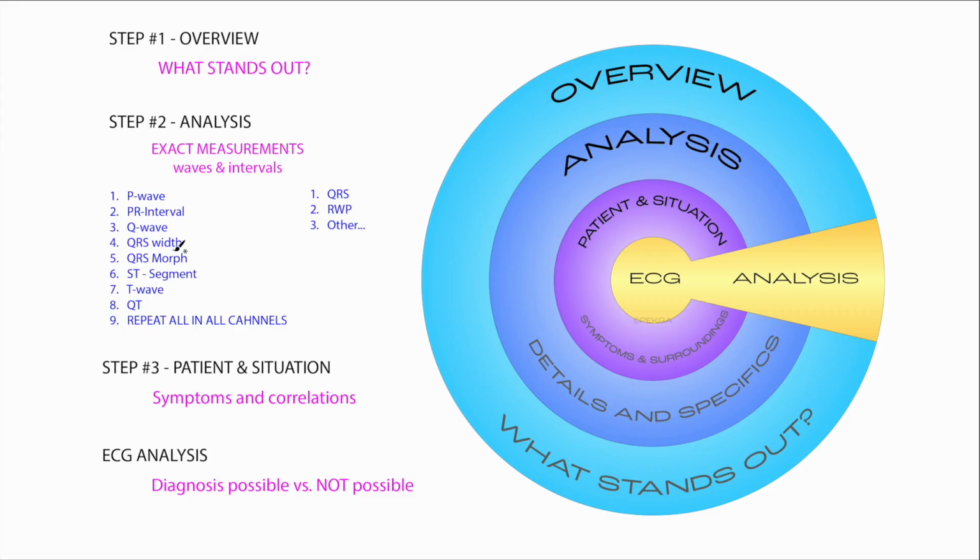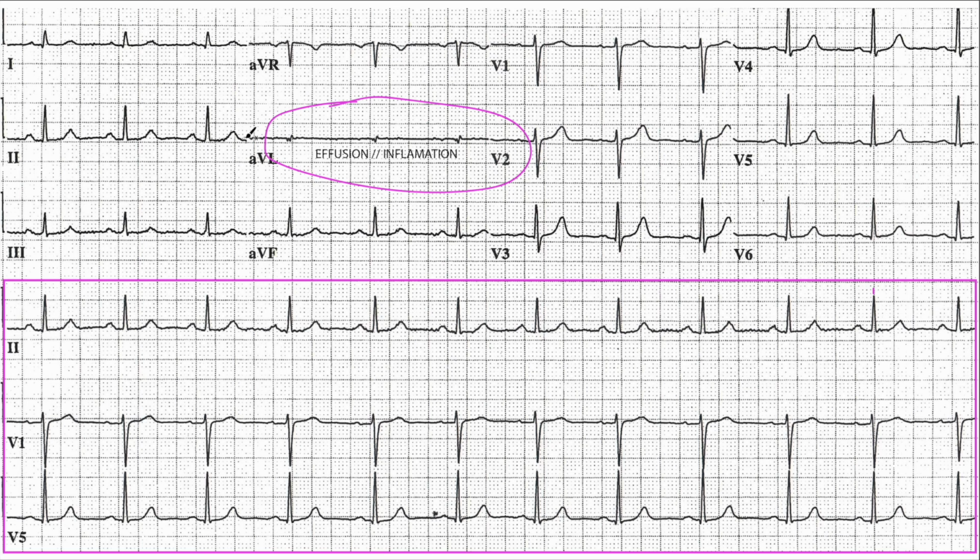However, when you're dealing with 12 leads, you can do this 12 different times if you really want to be thorough, right? I'm going to start on this side over here, and I'm just going to grab this QRS real quick. I like to do that. We use axis of deviation for a lot of things at PEKGA when it comes to more complex rhythms, right? So you can use your axis of deviation to figure out where your P wave is coming from, where your QRS is coming from, what's going on with the T waves. Really understand what's going on with depolarization using your axis.